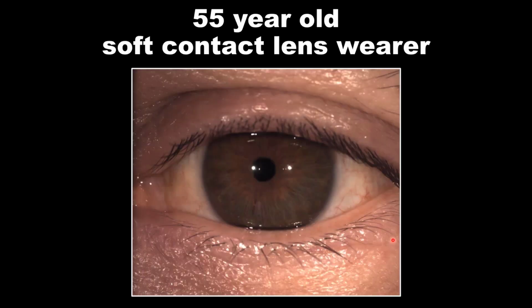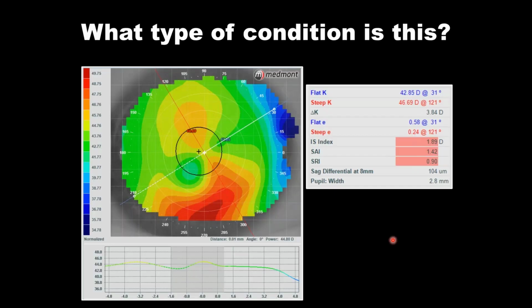Now let's switch to contact lens wear. Here's a 55-year-old patient that is a very successful soft contact lens wearer. And as we know, it's not uncommon for our patients to hit their 40s and begin to drop out of soft lens wear due to dryness or presbyopia creeping in. Why was this patient so successful?